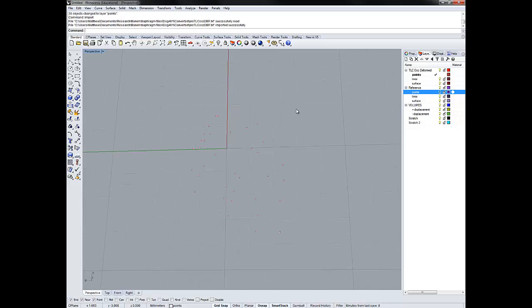I'm going to open my middle mouse pop-up here for you. The first one would be a control point curve. Notice if I left click, you can do a control point curve. The second way would be a curve through points. So if we do a curve through points, let's try that first.